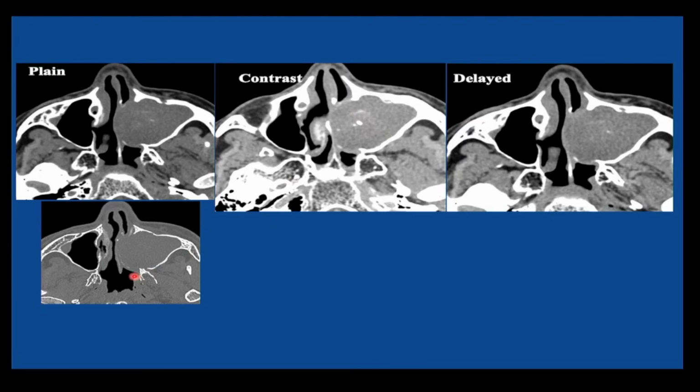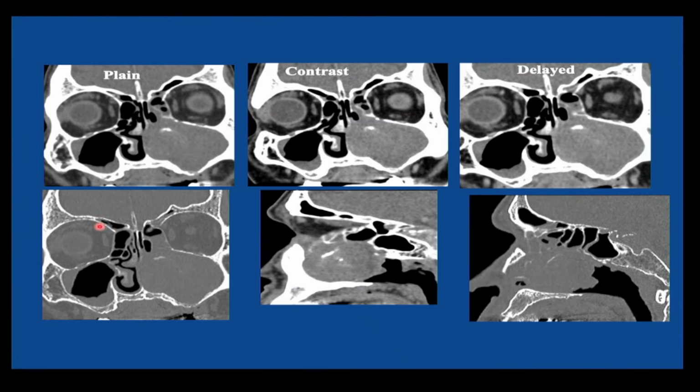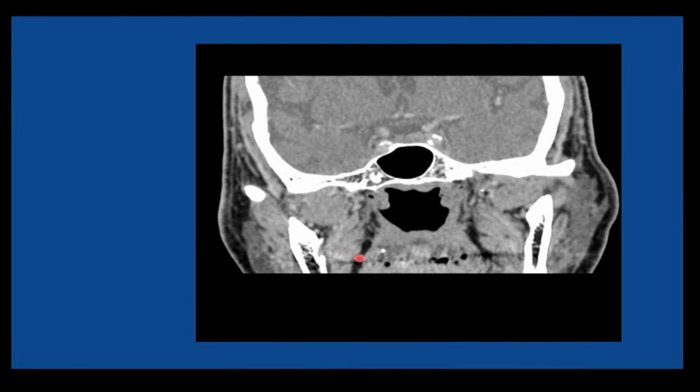I hope inverted papilloma is clear. Again, you don't look only at the coronal, you also look at the sagittal image, because that is where you are going to see the strut very well. Okay, it's fine. We go ahead.